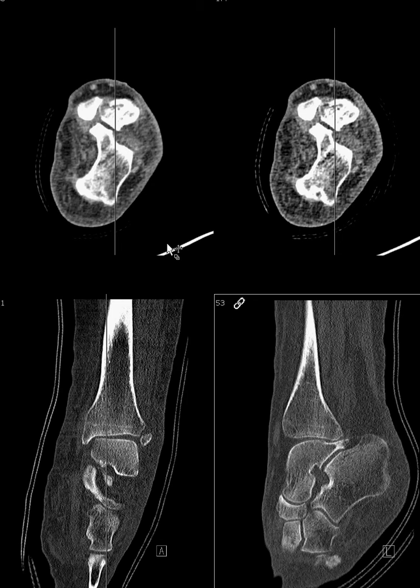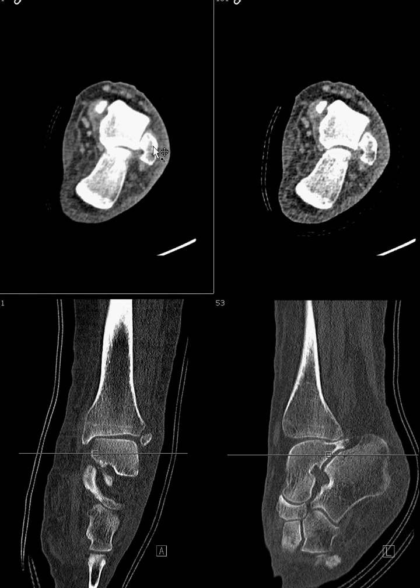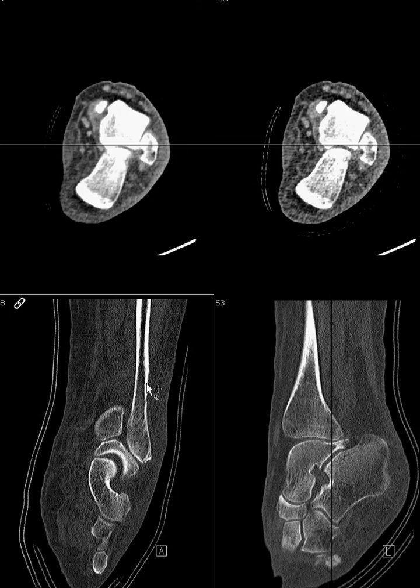Here's another example of ankle CT with inappropriate reconstructed planes or multiplanar reformats. So the axial images were obtained, as you can see here. And it's pretty typical. We have to get whatever the scanner can give us. But then in terms of reformatting, if you look at this attempt at a coronal and sagittal image, let's look at the cut lines that appear on the axial images. You can see that this image is simply done parallel to the tabletop with no regard to the actual anatomy or position of the ankle.